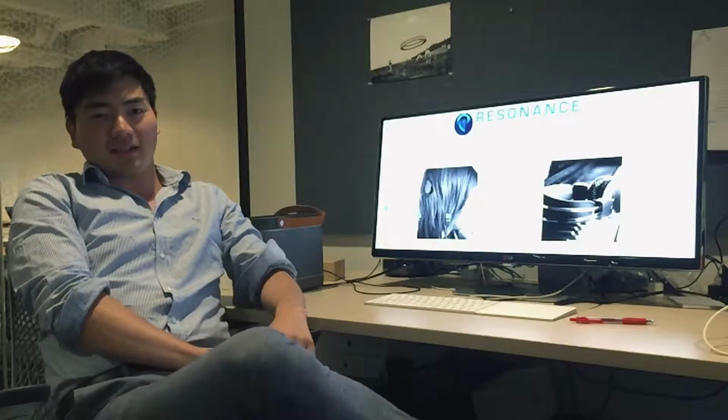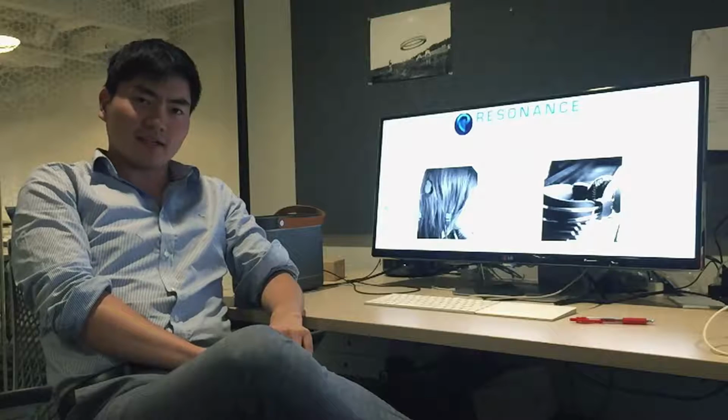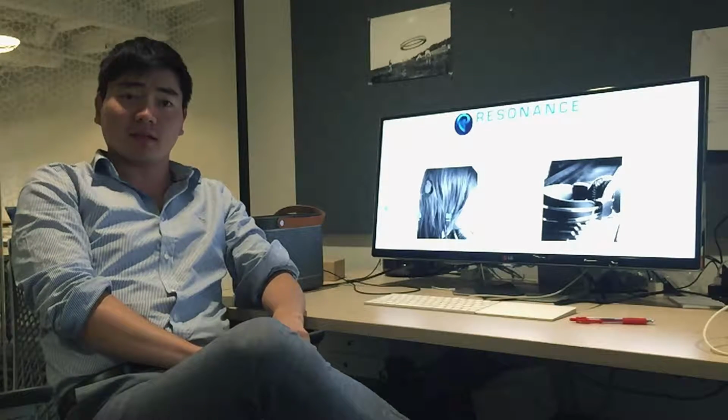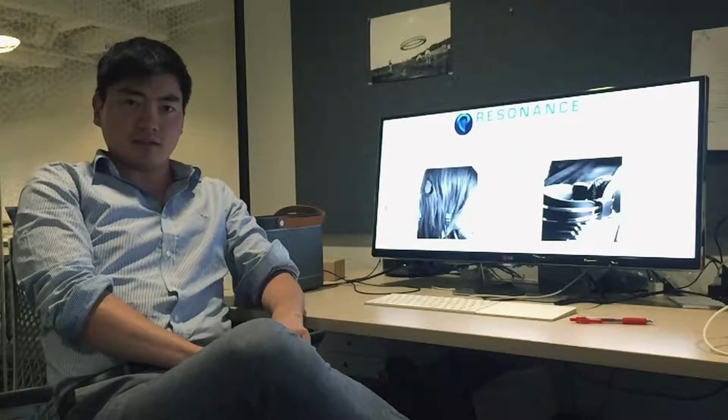My name is Chris. I'm the computational auditory neuroscientist here at Resonance Medical. Today I'm going to be demoing some of the optimization software we've been developing over the past couple months. I'm going to show you three main strategies that we've been using.